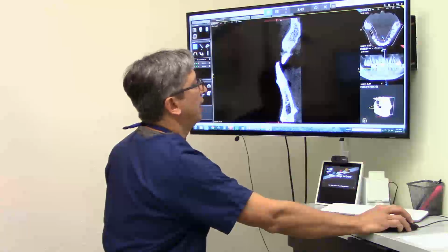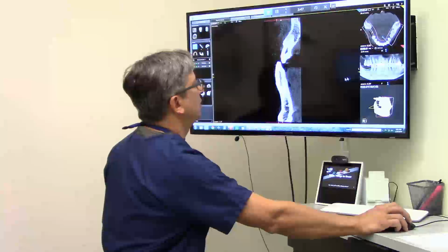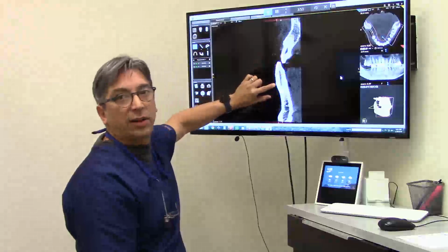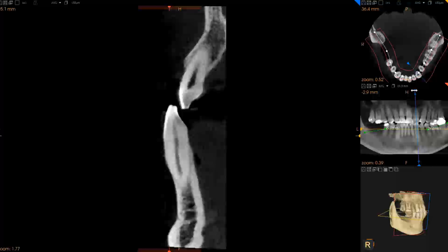And then if you kept looking, you might find some. Let's look at the canine here on the lower. This is where it becomes cautionary. On the canine on the lower, our bone only comes to about here, but it's very thin on the facial bone here on the canine. So this would definitely be a yellow.